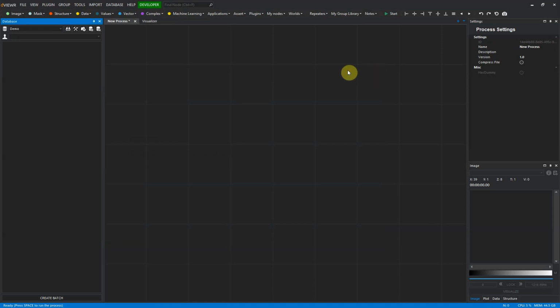Let's take a look at the database. It contains 3 subjects with random names. Each subject has one study with the study name diffusion, which contains a T1 weighted image and the diffusion weighted images. This is all I wanted to show you in this video.